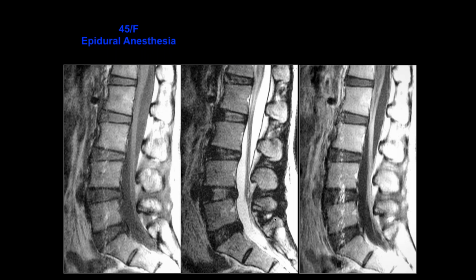Epidural anesthesia. Okay. Well, the nerve roots here look diffusely kind of thickened, and is that last one an enhanced image on the right? Probably, I think so. And enhancing. So here I would think more along the lines of arachnoiditis. But they're awfully thin. Arachnoiditis, oh, they're thin? You get a lot of irregularity and clumping and so forth.